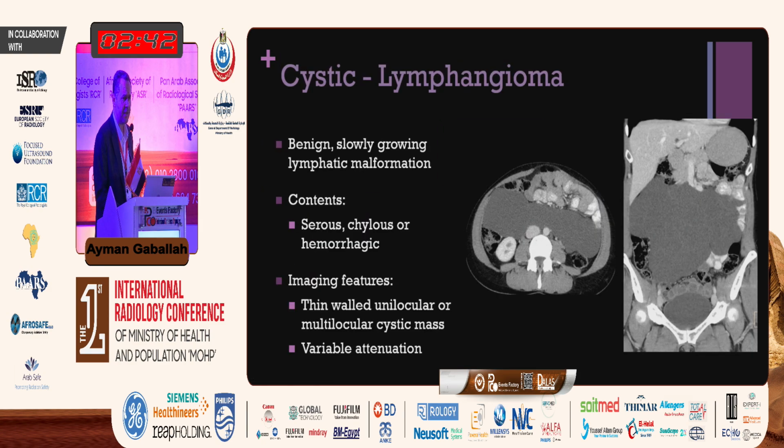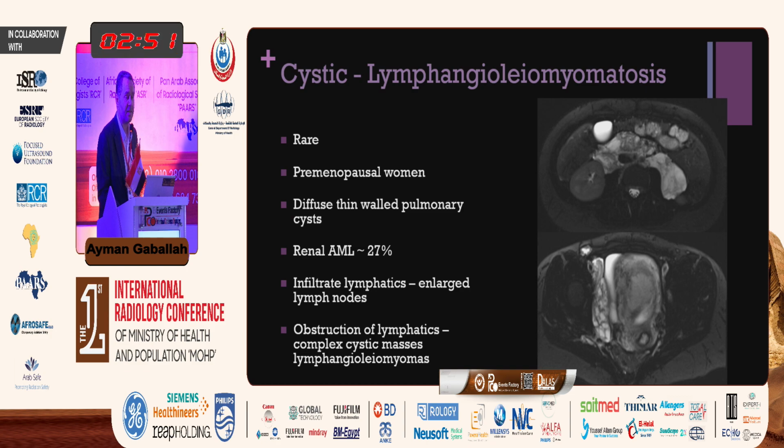Cystic masses, I have two interesting cases. One of them is very straightforward, a huge lymphangioma, and as you know, lymphangioma does not respect tissue boundaries. And this is a really interesting case. This was a young female, 12 weeks pregnant, and she has this kind of cystic/solid mass in the retroperitoneum, and it was going also into the pelvis.